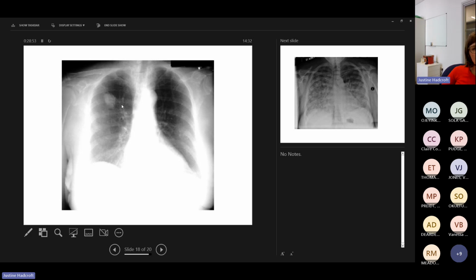What else should we look at if we see tumours? I suppose, is there any pleural effusion? I think probably not. If you had enlarged lymph nodes, you might see some bulkiness here at the hilum. There's nothing on the left-hand side. The bones look okay, so there's nothing that looks like rib metastases. So this looks like it's probably a right upper lobe tumour, and you proceed to a CT scan to investigate that.